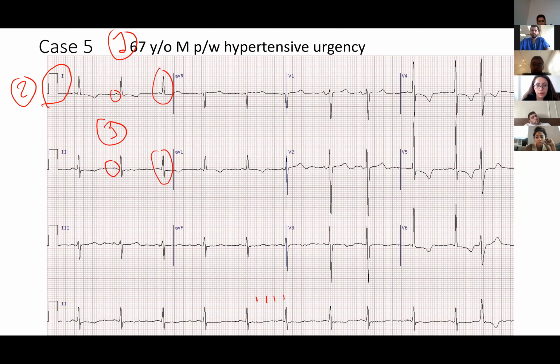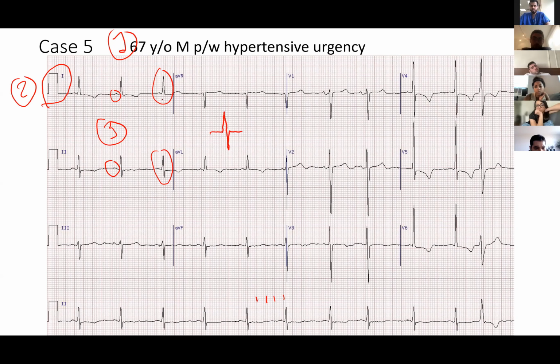So just pointing out, when somebody is saying that it's isobiphasic, that means exactly the same positive as negative. It's not the case here. It's more positive. Yeah, you're right. The only thing you want to see is whether it is more positive than negative, basically. So it's a normal axis, right? Anything else in general that you want to point out?